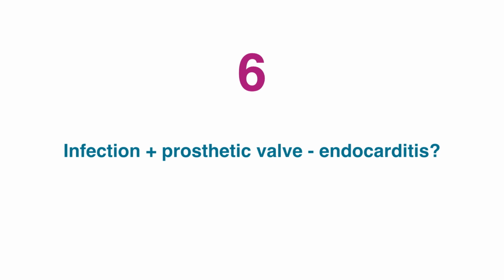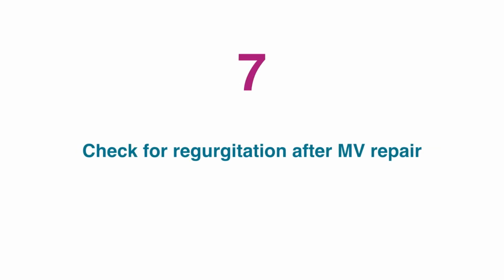Six, infection and prosthetic valve. Remember, always look for endocarditis and perform a TEE if there is suspicion. Seven, check for regurgitation after mitral valve repair.